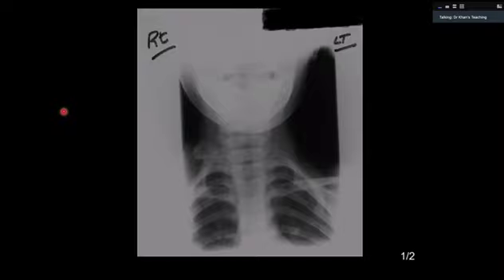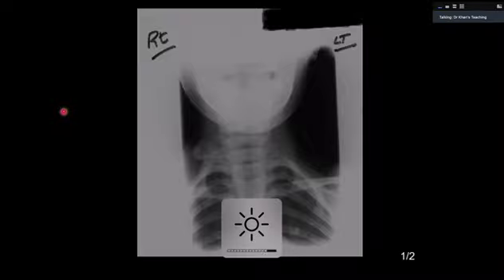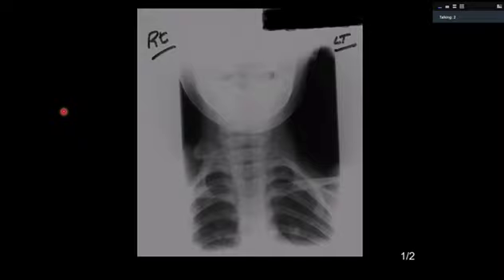So what is an omovertebral body or omovertebral bone? It's usually a connection between the vertebra and the scapula. And when do you see that? I think there are some associated conditions you can get it with. Klippel-Feil syndrome is one of them. Pycnodysostosis. Do you see any stigmata of anything on this film? No.